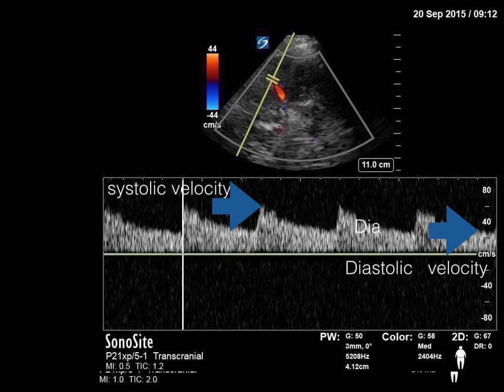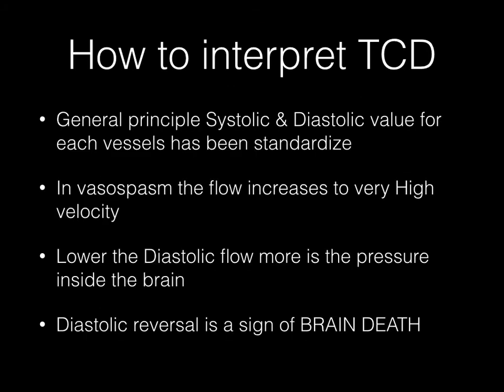Systole might remain the same or high or whatever. That is known as the beacon sign. The pulse lights on and off. So basically, there will not be any diastole. Rather, it will be negative in brain dead patients. Okay. So how to interpret?